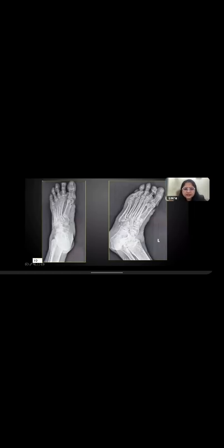Osteomyelitis in this patient, in this area, you can say that bone is also getting involved because there is some lytic lesion just beneath the ulcer. So initial, acute osteomyelitis can be said to be occurring in the area of the head of the first metatarsus. Madura foot can also have a similar appearance. It is very likely to have a similar appearance in Madura foot as well.